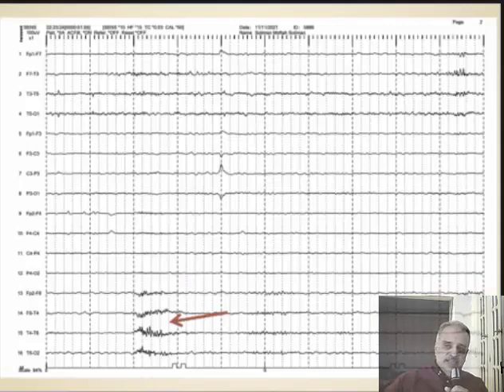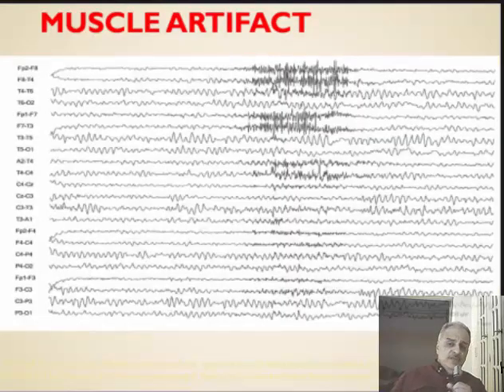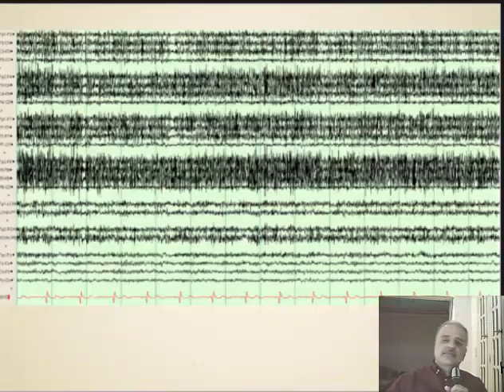Sometimes it is localized, like those found on the right temporalis muscle, or diffuse on more than one side. Here on the right side, more evident than the left one. Sometimes widespread, like those seen bilaterally.